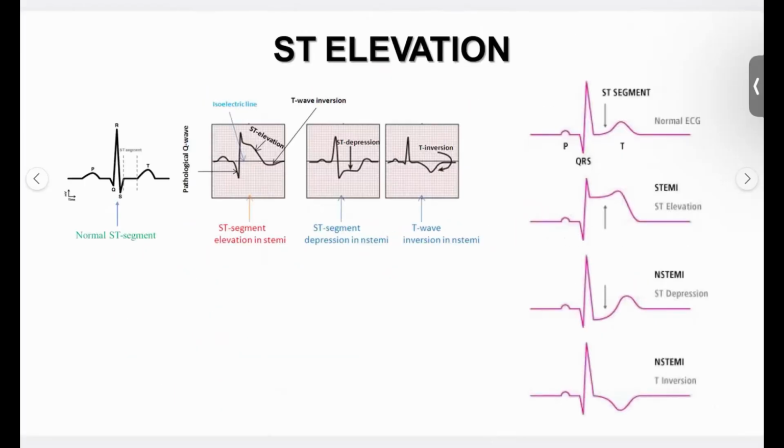So next, moving on to ST elevation, guys. What is the ST elevation that we have to understand? As we have seen before, ST elevation or ST depression is differentiated at the J point. We have to look at this ST point.